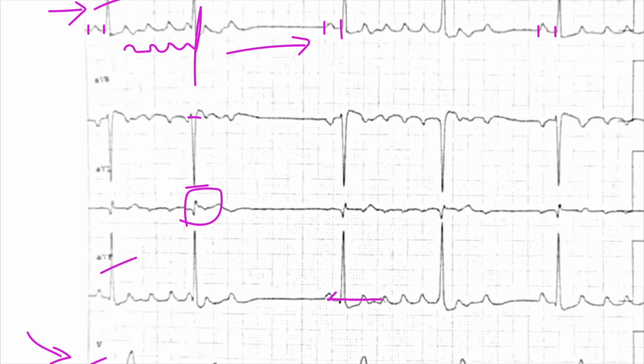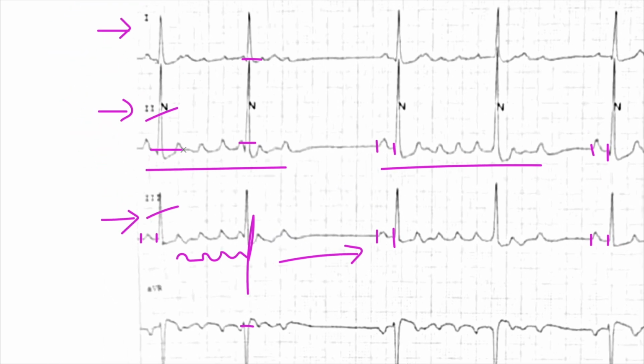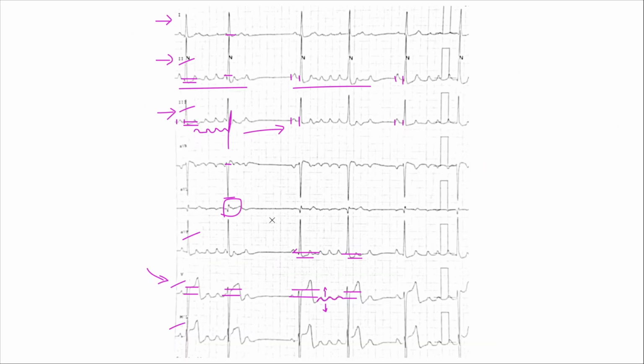look at this. It looks like we're having a little bit of ST depression. So it looks like we're having a little bit of ST depression going on here. Here it's very subtle. And yes, indeed, this patient, I don't know, they could be having some sort of an intermittent spasm. So one of the blood vessels is under stress for whatever reason, and it's constricting the blood flow, and this is maybe what's causing the atrial flutter.